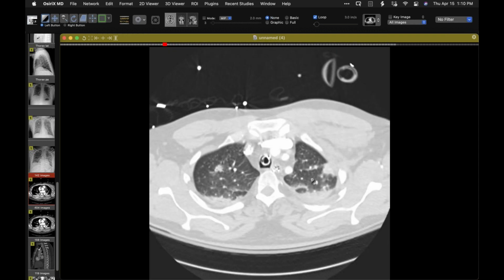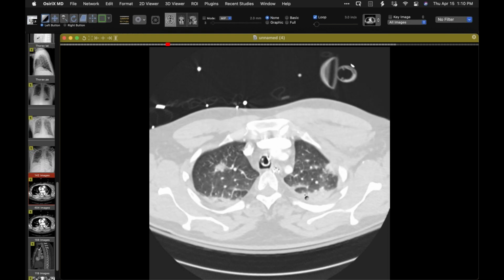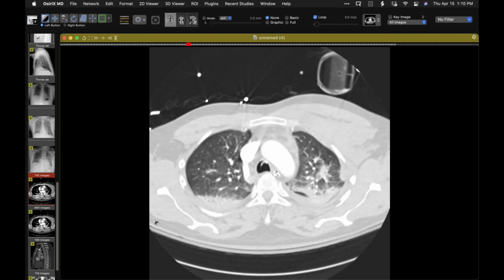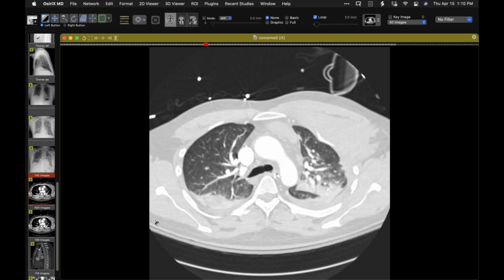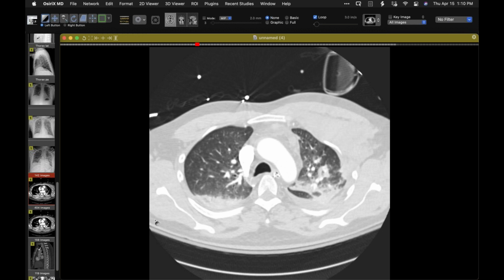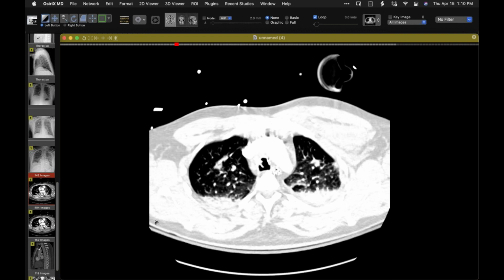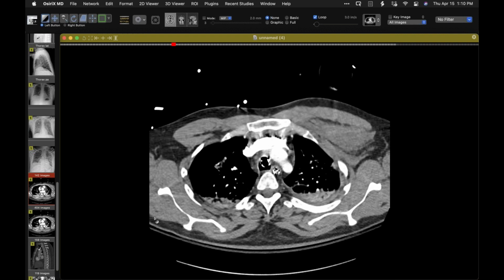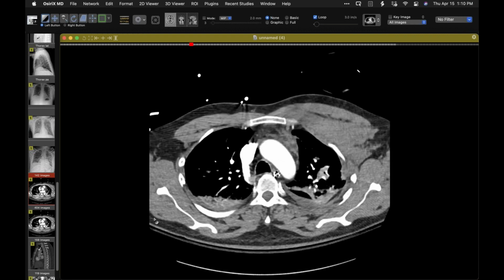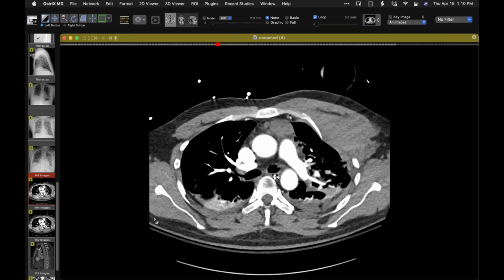Maybe the most substantial CPR-associated injuries. Oh, there's also mediastinal air just in that location, which I think is reasonably attributable to the Macklin phenomenon associated with the chest compressions, most likely. So anyone think that none of what I've mentioned is probably CPR related? I think they all are. The basal atelectasis in an intubated patient I expect, but all the other findings that I showed. The only ones I would, and I'm not sure, you may be absolutely right, is those possible contusions.